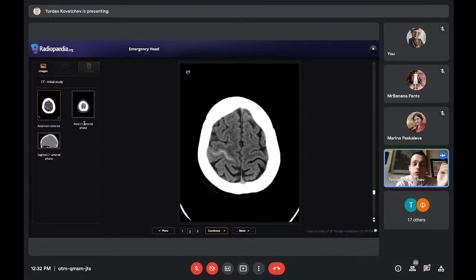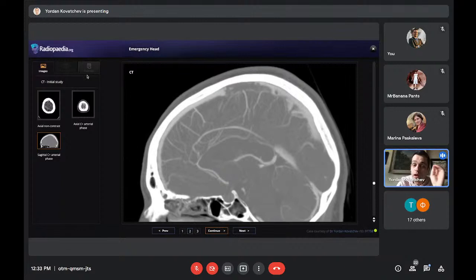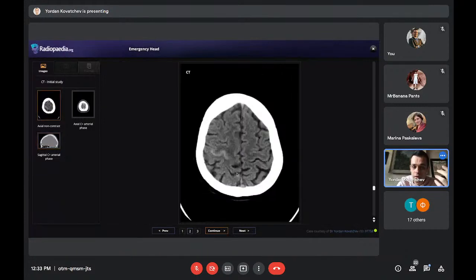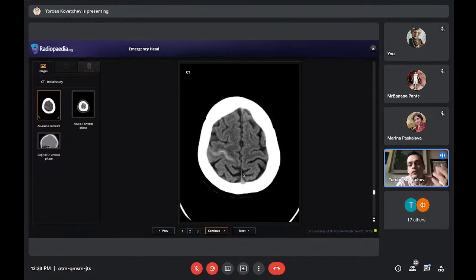It's so crucial to notice this, because it's a few days after complaints, the patient had thrombolysis and recovered completely. But if she didn't, she would develop a really big infarction of the brain. She already has infarction, but venous infarction is reversible really well. It responds really well to thrombolysis. So you need to notice this.